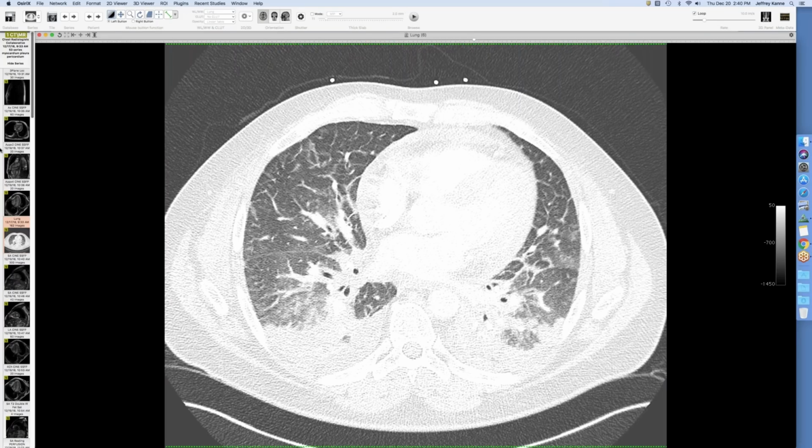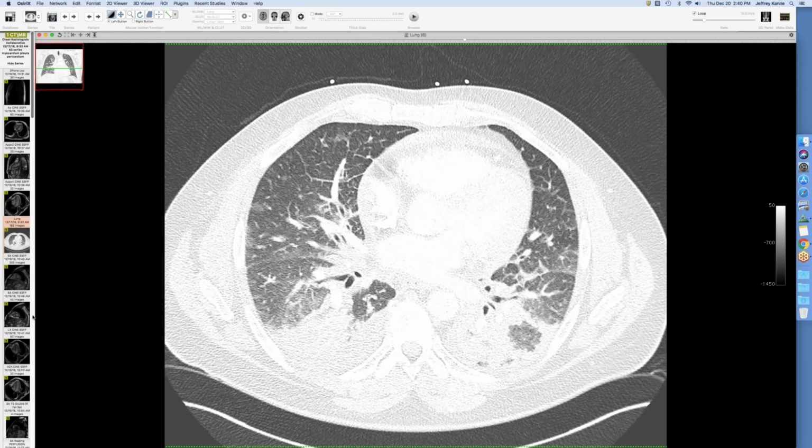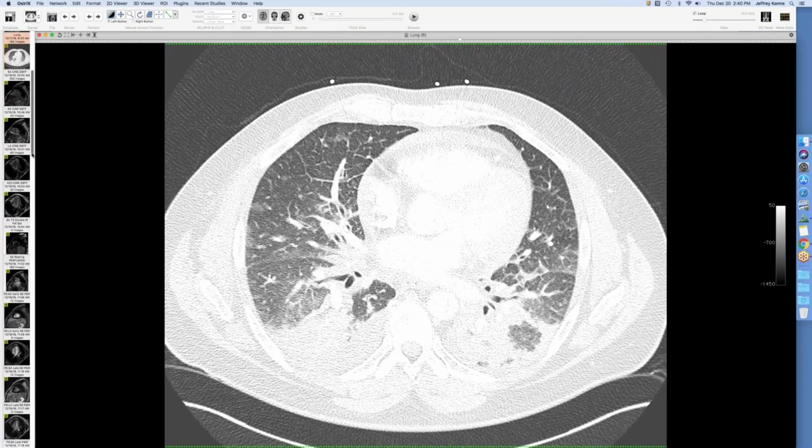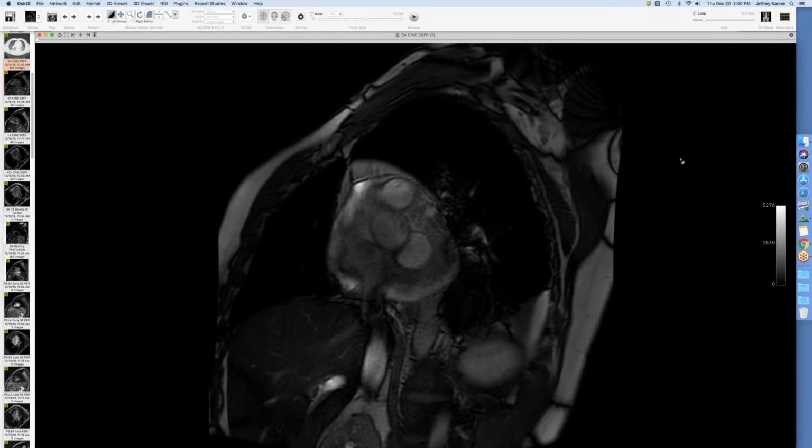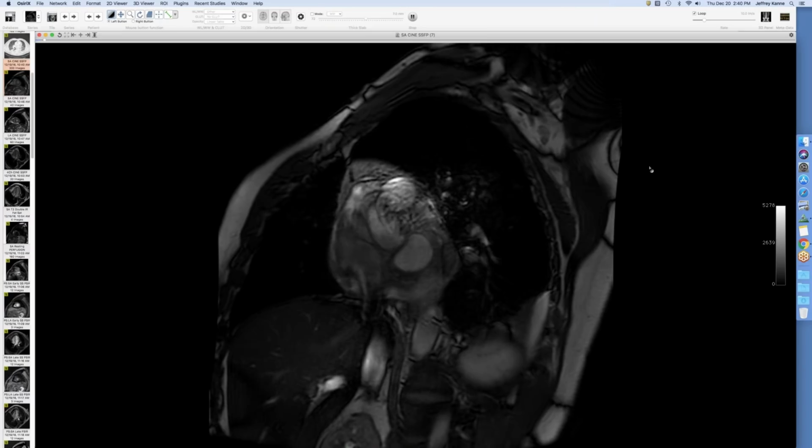Where is it on here? Yeah, just grab it and drag it over. You can scroll down and change the series. Yeah. So I think if you want to send it, just hit the space bar.